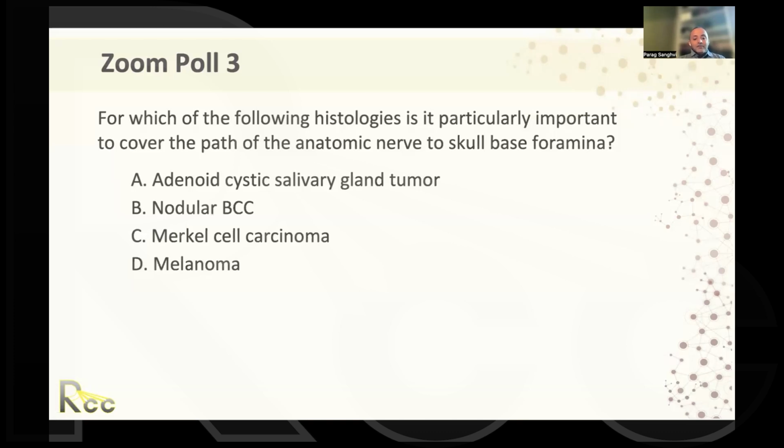Now, to your point, if somebody has extensive PNI, are my CTVs slightly bigger? Absolutely, because I worry a lot more about the branches, the unnamed branches along the skin. So my skin margin is going to be very generous for somebody with extensive PNI because I really want to cover the resection bed with as wide a margin as I can get. So generally on the order of 2 to 3 centimeters for those patients on the skin.